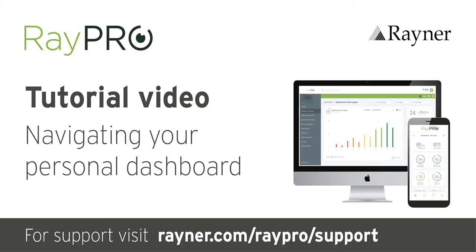Welcome to a short series of videos to get you up and running with RayPRO, a desktop and mobile platform that allows you to effortlessly collect insightful patient-reported outcomes for 3 years after cataract surgery. In this short video, I'm going to show you how to navigate your personal RayPRO dashboard using both the mobile app for Android and Apple devices, as well as the version that can be accessed via a web browser.